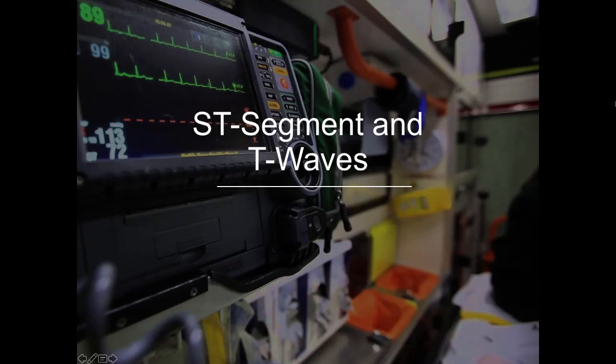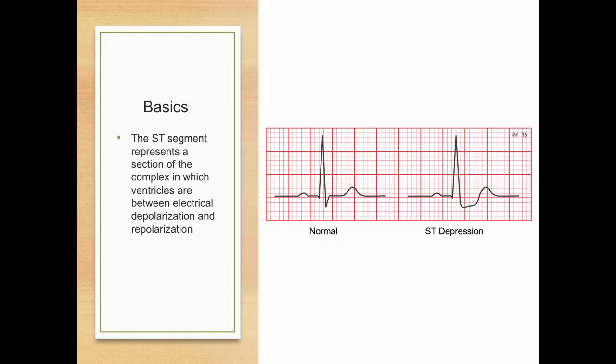This week we're talking ST segments and T waves and the funky thing that goes on with them. The ST segment itself starts at the end of the QRS complex, right here at the J point, and continues to the beginning of the T wave. So that's what we're focusing on here, the ST segment itself.